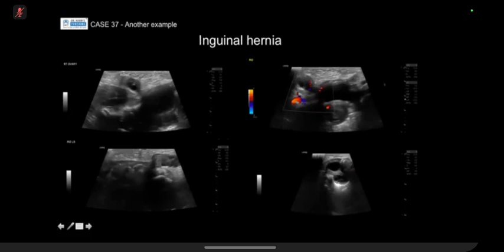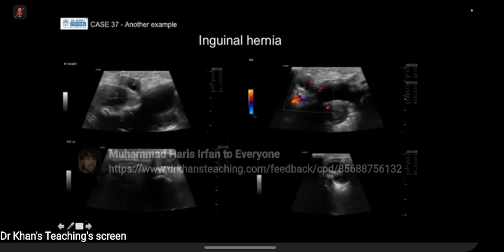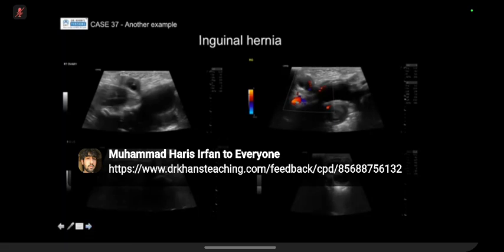This is a case that we had of a month-old neonate, and she presented with a swelling in her inguinal region. Here we've got herniation of the right ovary. We can see some follicles in that inguinal canal via the canal of Nuck that's not been obliterated. So this is the right ovary sat in that inguinal canal, and this is her left ovary sat where it should be in her pelvis. She went to theatre for a repair and reduction, and her ovary was viable. As we can see, there's colour flow within it on ultrasound.